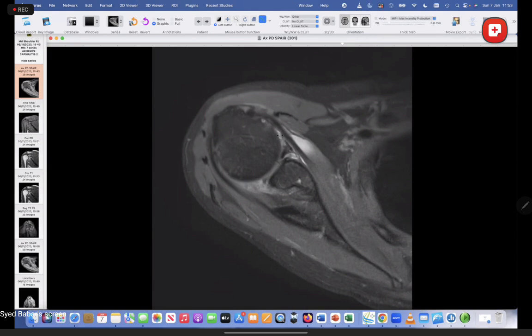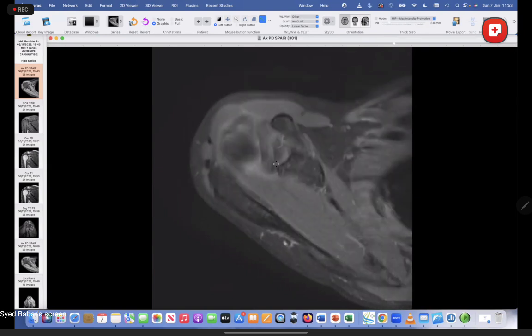If you see a black line, that's the glove. But when I show you an arthrogram, you'd be able to see it beautifully. This is the middle glenohumeral ligament. The superior glenohumeral ligament is actually running here, and this is the biceps. That's probably part of the superior glenohumeral ligament. Remember, there are two black structures. The longer one is the biceps. The shorter one is the superior glenohumeral ligament, and it runs parallel.